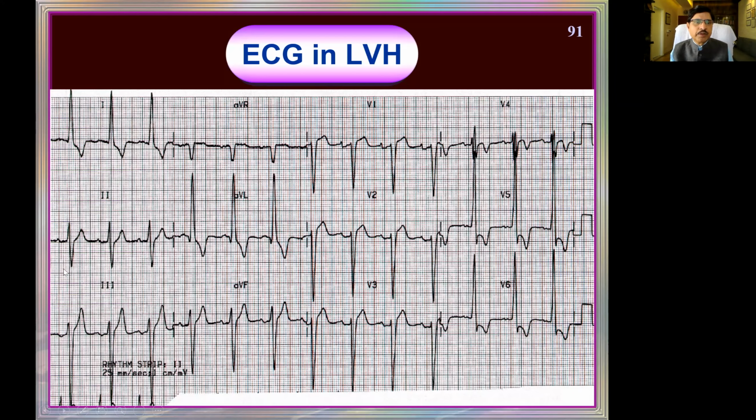Okay. Is there any right atrium? No. Is there any left atrium? Yes. The duration is 4 squares here and the downward component is prominent. So I have an ECG with normal rate, with left axis, no right atrial, left atrial, and left ventricular changes. I have to see L1 plus L3. I have to total this being 1, 2, 3, 4, 20, and this itself is 30. 30 plus 20, 50.